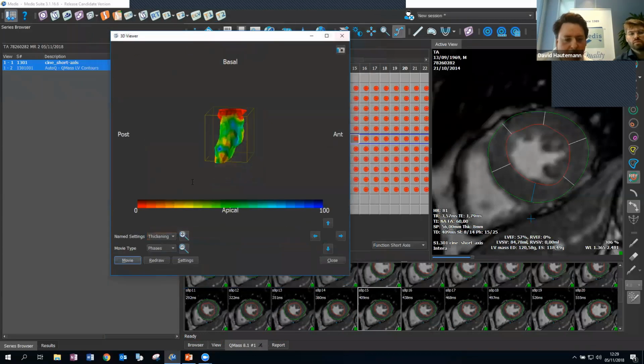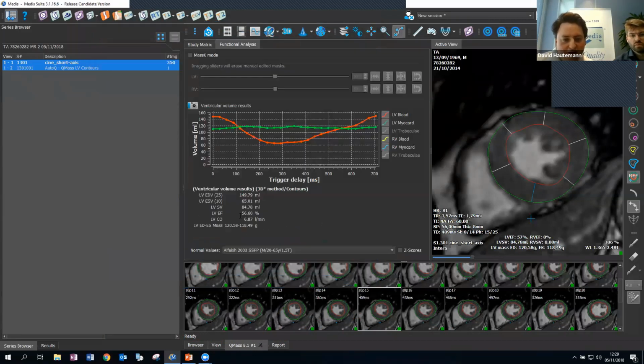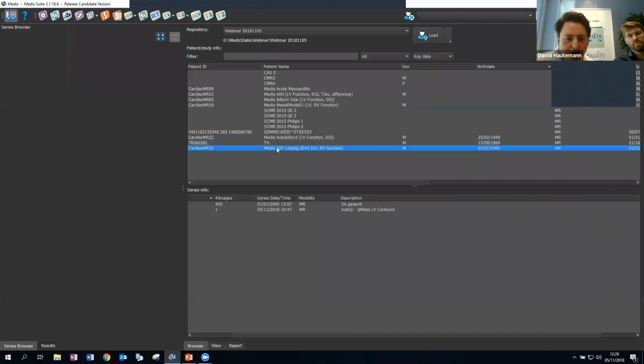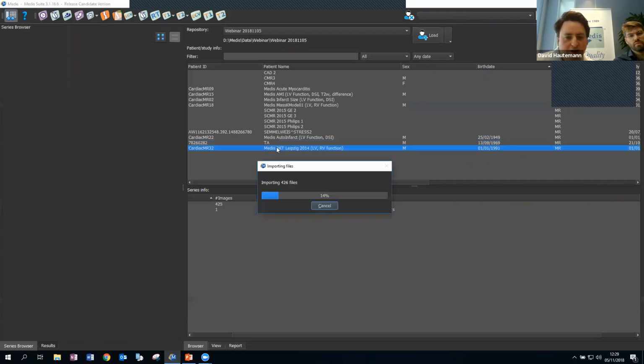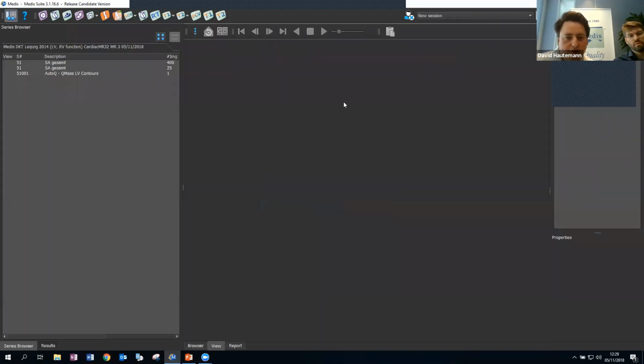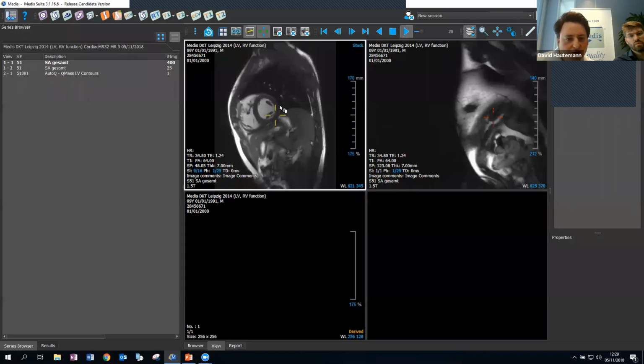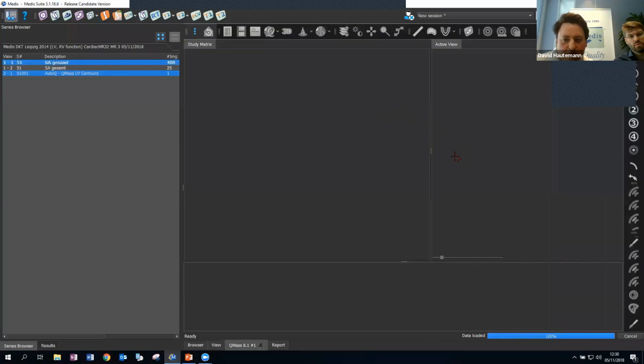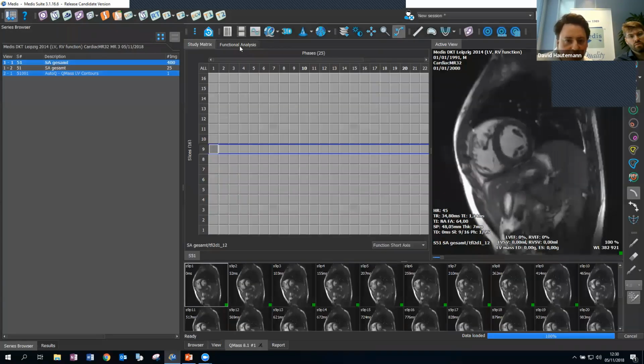Yeah, about the constraint, I really don't know if there's one, but they are remarkably close. I have seen some cases where they're a bit more off as well, but I think if the detection works quite nicely, then probably they're close. So here's another case. Also Siemens. No, this is a Siemens.